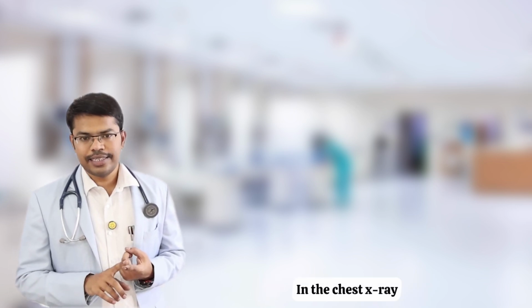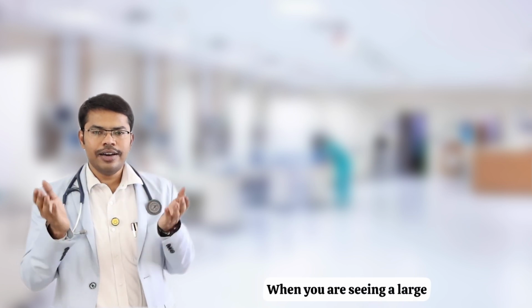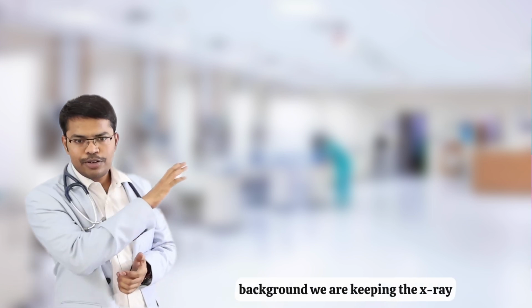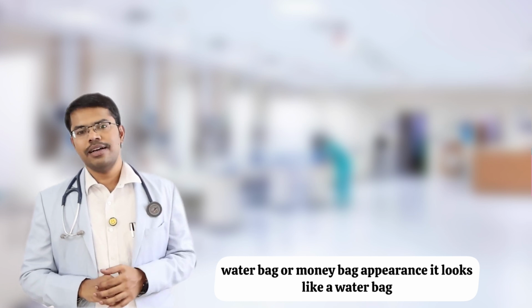Coming to the chest X-ray first. In the chest X-ray, mild effusion you might not be able to see any finding. When you are seeing a large globular shaped appearance, probably in the background we are keeping the X-ray, water bag or money bag appearance.